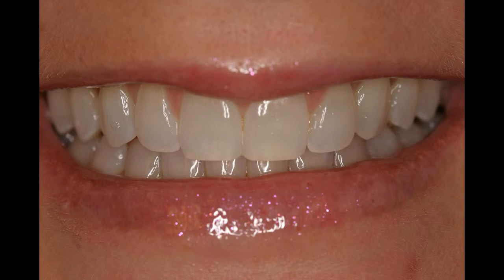That's the smile shot. So we put this smile shot up very often, leave it up for a couple of minutes. I may walk out and do a hygiene exam. My assistant may be recording some other things we need in that appointment. But a patient has 30 seconds to 3-4 minutes to really focus in on that image without anybody introducing any verbiage at all.